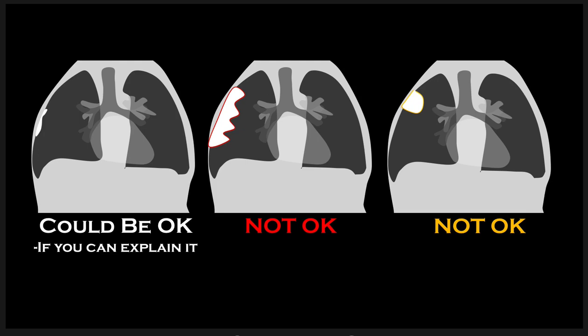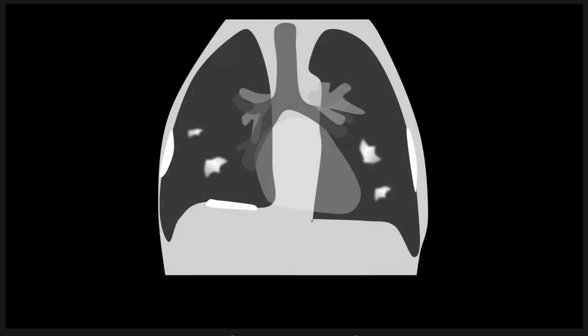Alright, so I mentioned before that mesothelioma is a possible cause for a mass-like pleural thickening, and that's commonly seen in the setting of asbestos exposure. The other thing that's seen in the setting of asbestos exposure are calcified pleural plaques. You see these things, focal areas of pleural thickening. The degree of calcification is variable. It can be lightly calcified, progress to densely calcified, almost as calcified as bone, like real white, real dense looking.